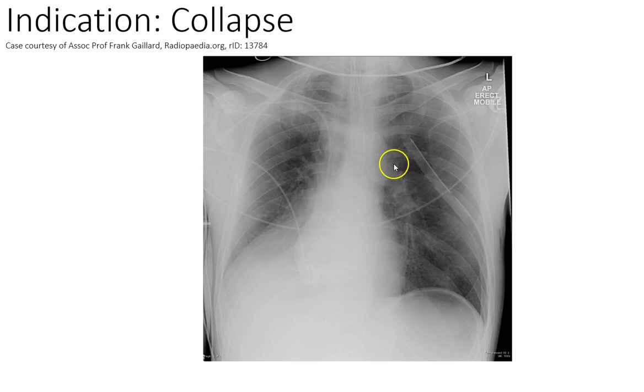So the next thing, I've had a look at my patient's position. I've noted that it's quite a white film. I've noticed that the patient is quite rotated. I'm just going to see how the ribs count down. 1, 2, 3, 4, 5. That's the 6. But it's hard to see where that hemidiaphragm actually comes in, isn't it? It's really hard to see that.